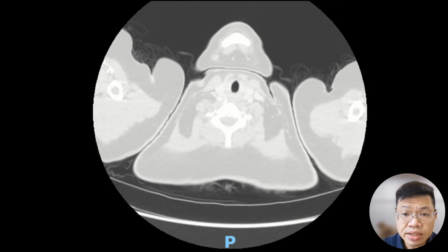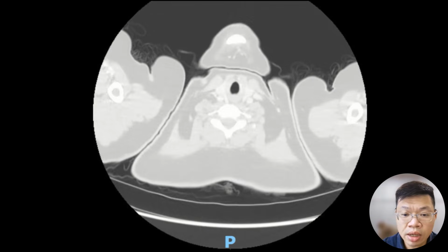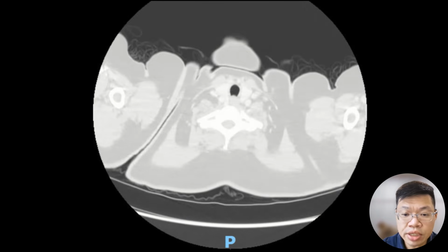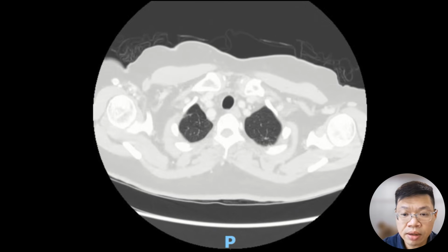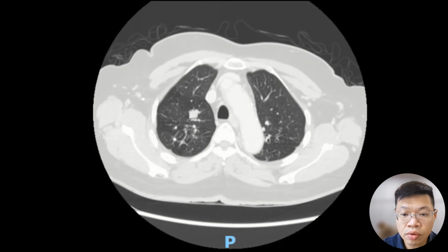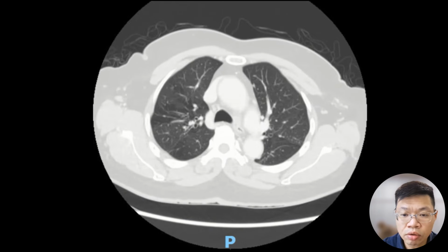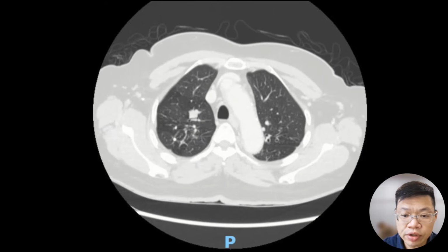In this first case, the nodule of interest is located in the right upper lobe. As we scroll through the CT scan, we will see that there's a nodule of interest located in the right upper lobe. Going back to the nodule of interest, I will highlight it with a red marker as indicated over here. How can we then draw a path to this nodule?